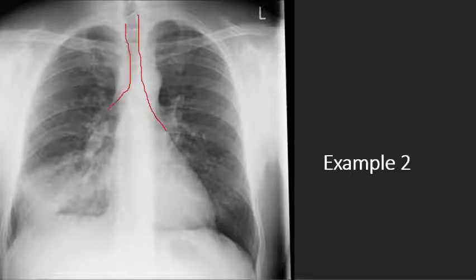And then kind of go over here. Can't really see the carina very well, but in my mind's eye, it's there. We're not really deviated. Looking more towards my carina and my hilum, I don't see anything. Some congestion here a little bit. And when you go to your B for your lungs, starting on the left side, we see a little bit of hilar congestion. There's your aortic knob. Don't really see pneumothorax. And we go to the right side and we're like, oh man, what is this?